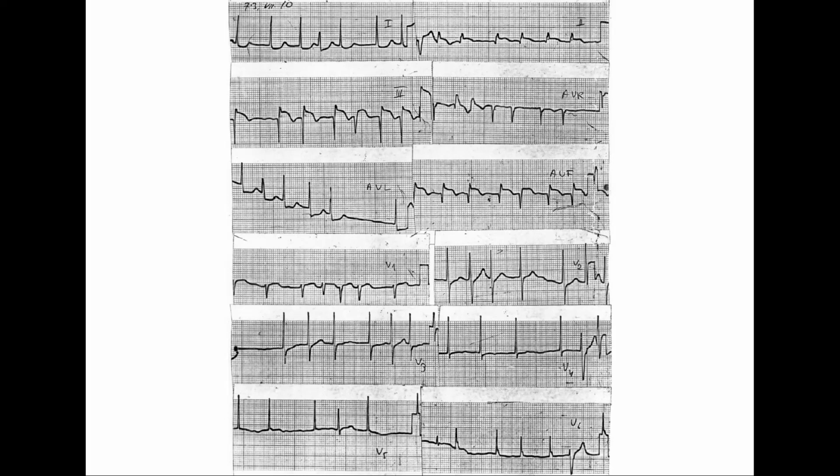Lesion, with the myocardial infarction. Yes, but which phase? If you do have Q wave and ST elevation, it would be acute phase, I believe. Exactly, acute. So we do have an acute inferior MI, yes? Okay, now let's move on.